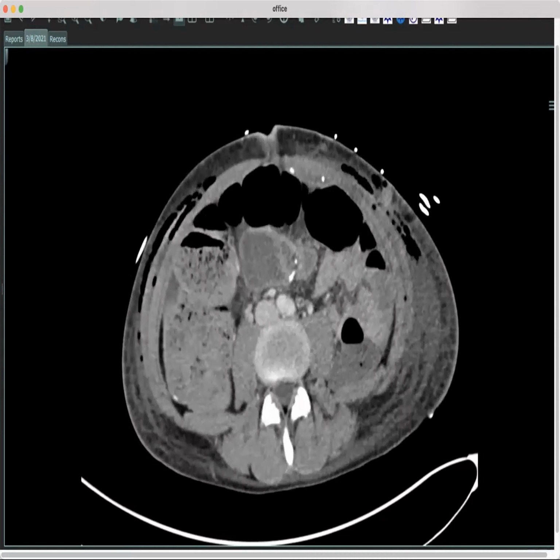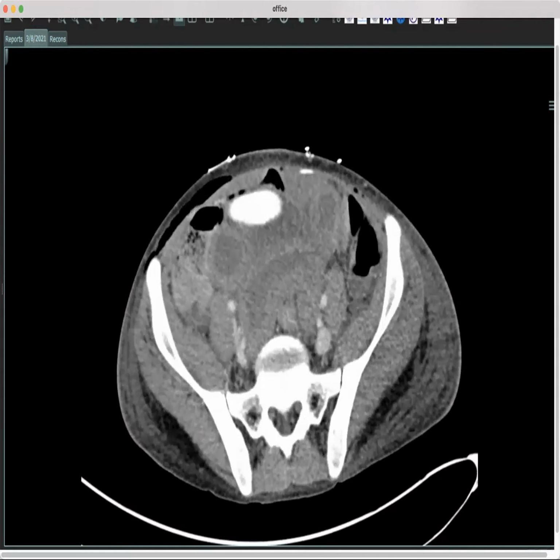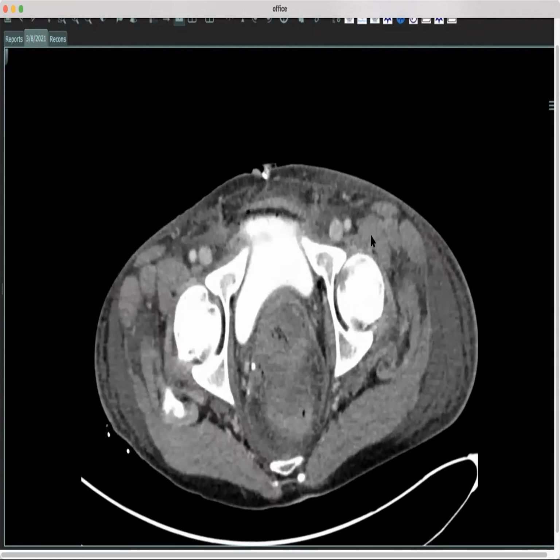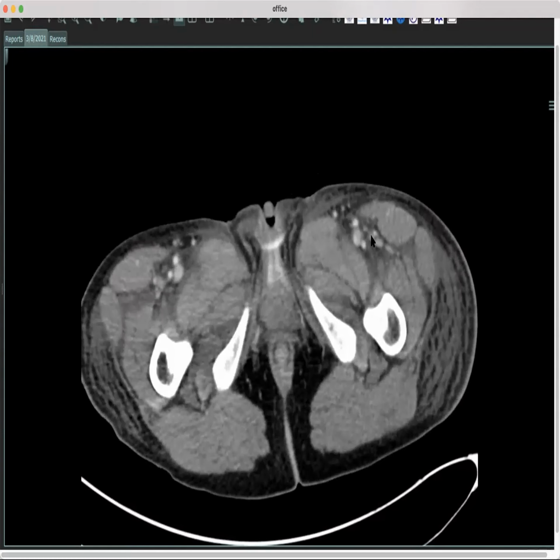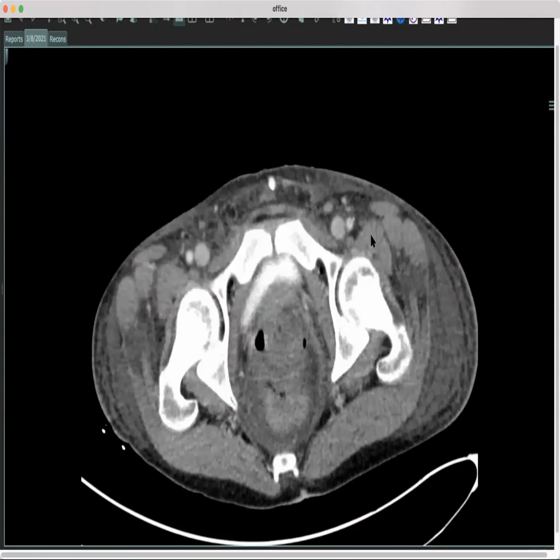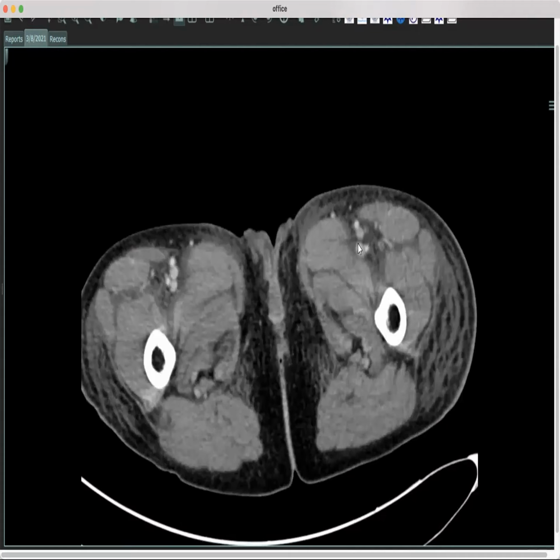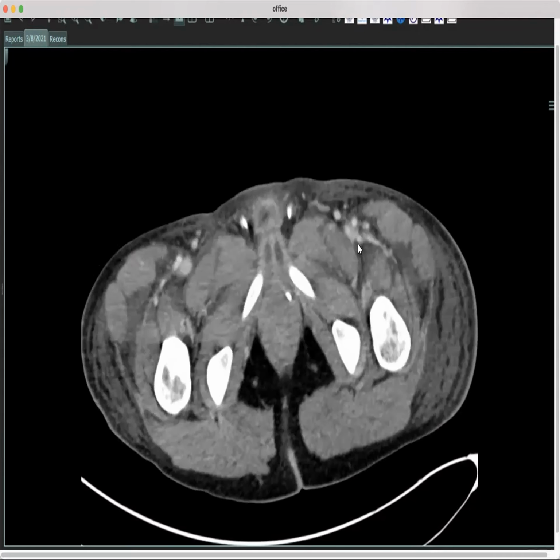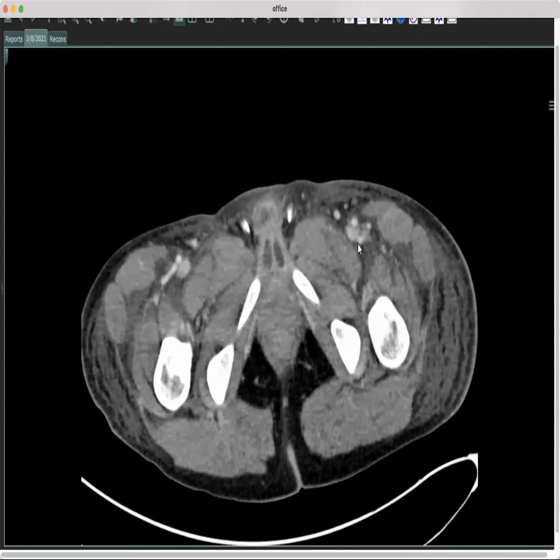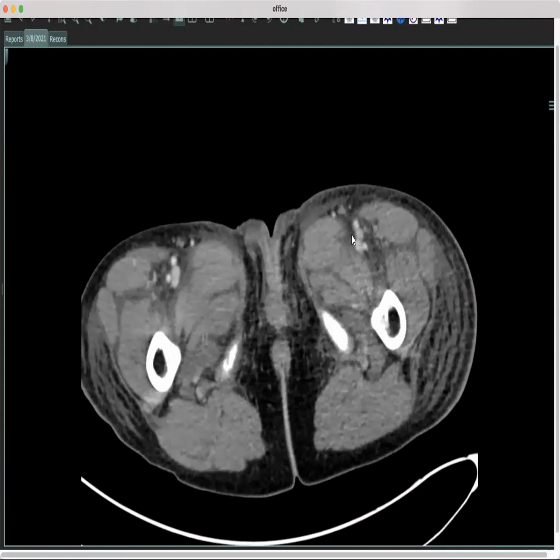Aarti, I'll rely on you to look at the chat for anybody. So the key elements are down here in the pelvis. And some of the clues to what might have recently happened are down here. Anybody have any idea? So one thing that's a clue here is the genitals. Looks like there's something that's happened down here.